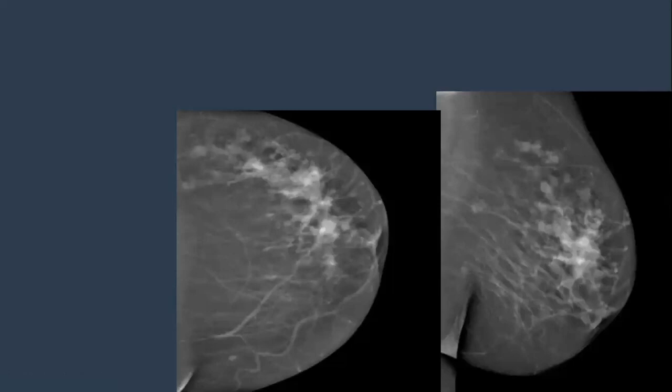Her breast is almost fatty. That means what I have seen here is an abnormality. Yes. So associated with asymmetry. Yes, excellent. There are multiple focal asymmetries occupying the whole area, or giving global asymmetry due to multiple nodularity. You can describe it in any area.